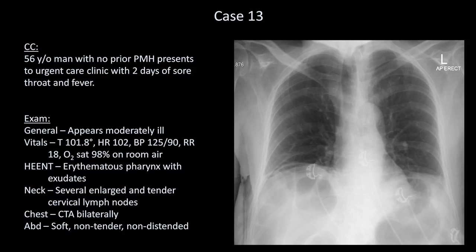The first thing to notice is that the lungs appear to be a little on the small side. If you recall from lesson 3, there should be 9 to 10 posterior ribs visible on a standard inspiratory PA film. If we count the posterior ribs in this case, we see that there are only 8.